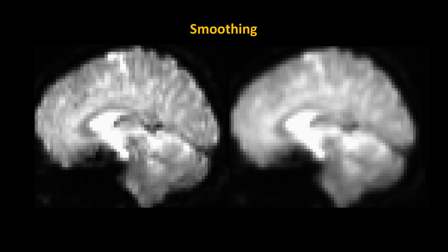the default preprocessing pipeline is going to do smoothing as just a normal processing step. But when it does the analyses, it's actually going to take the time series from the unsmoothed data. Why would we do that? Because if I'm taking a seed region of however many voxels, tens, maybe 100 or so, you're already averaging across all those voxels.